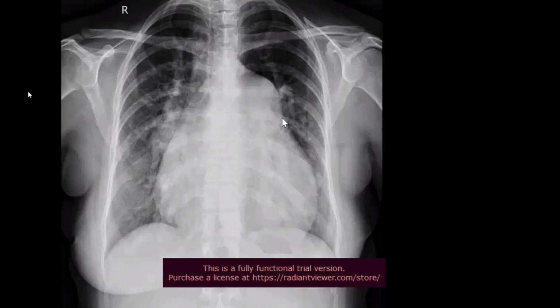So what is the main finding? The pulmonary conus area is prominent. What is the most common cause of this prominent pulmonary conus? Pulmonary arterial hypertension. And that is due to what? In children, usually atrial septal defects. I'm basically not a cardiology or pulmonology person, but atrial septal defect is the commonest cause with this appearance, because that leads secondarily to the hypertension with enlarged mediastinal vessels and the engorgement.